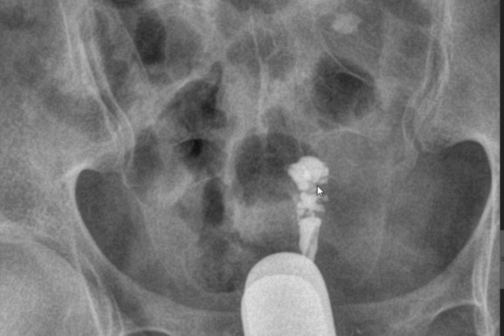What are these lines you see in the endometrial cavity? You see these lines, these things here? These are most probably adhesions. Yes. Adhesions in the endometrial cavity, what is that called? Synechiae or Asherman syndrome. This is very typical Asherman syndrome due to endometritis. So old endometritis with adhesions.